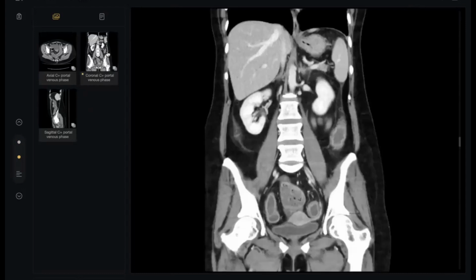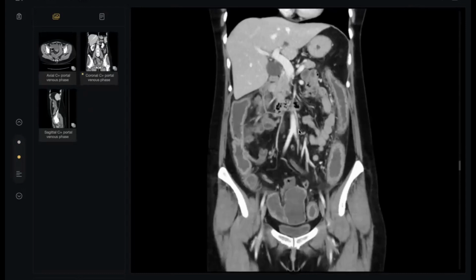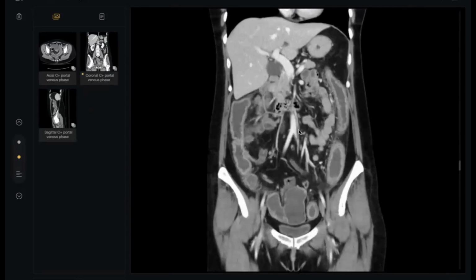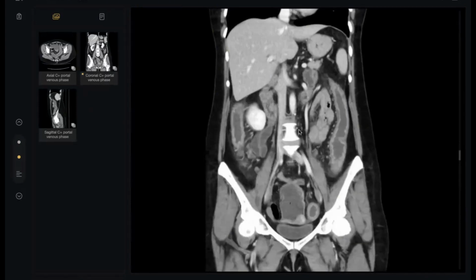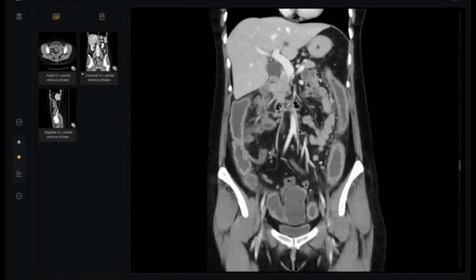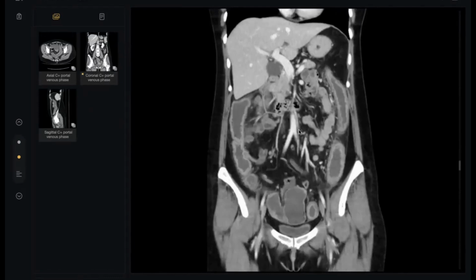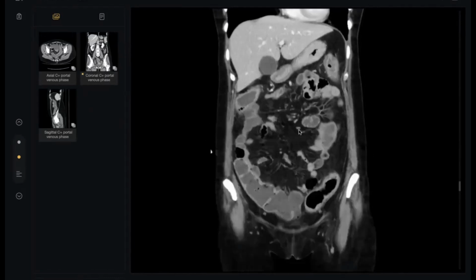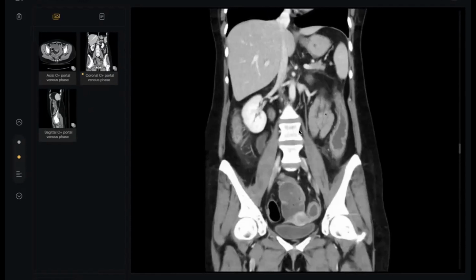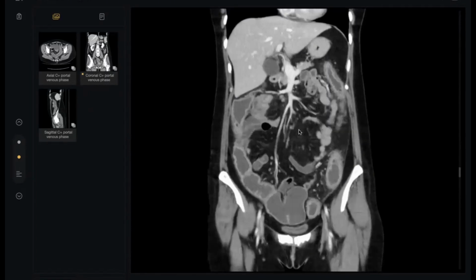So our doctor asked for CT for pancolitis. In pancolitis, don't put ischemic colitis; if you want to, put it at the bottom of your list. Number two, the vessels are intact, so you can absolutely exclude ischemic colitis. So we are dealing here with pancolitis. It's either infectious or inflammatory.